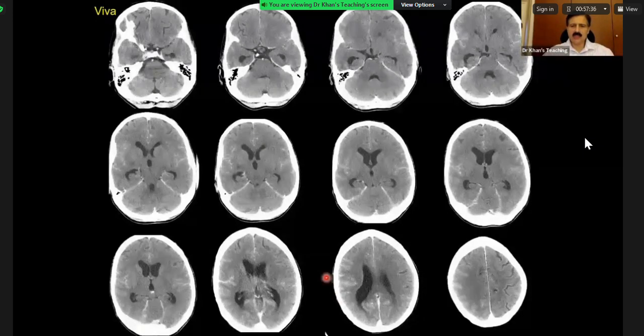You remember the FLAIR sequence where you have to differentiate between giving contrast, is it leptomeningeal versus subarachnoid? Similarly here on the CT, they can show you as a trick case. This is with contrast, and once you pick it up, it is with contrast. There is bilateral symmetrical leptomeningeal enhancement, you can see, look at these sulci and look at these sulci, these are effaced, means more edema on this side. And then you come to the differential, which can include things like TB or fungal infections or carcinomatosis. We'll come back to similar cases in infection.